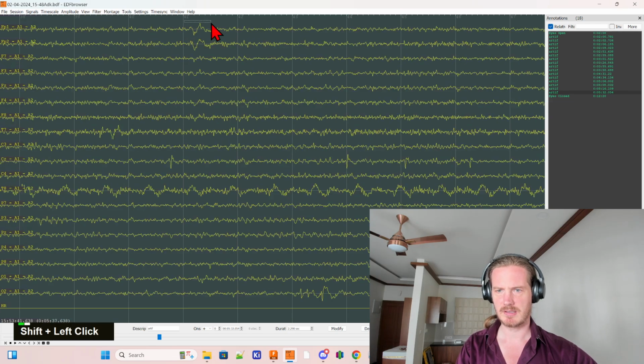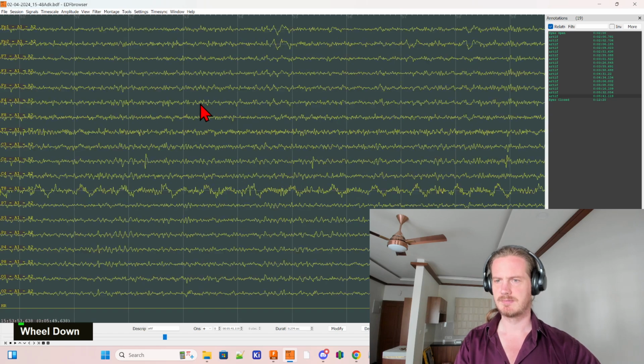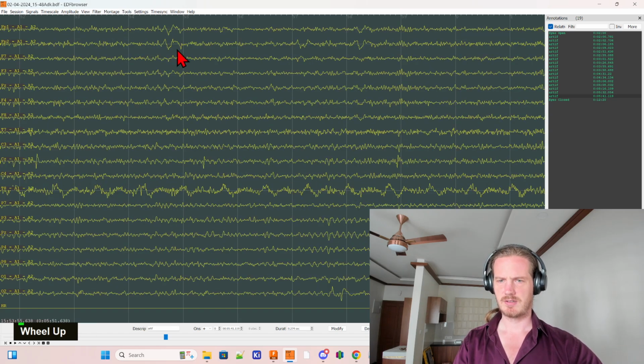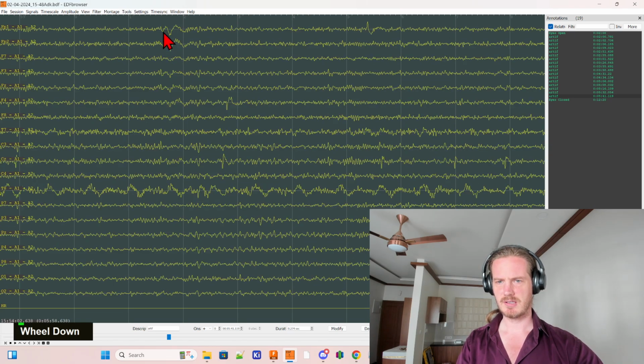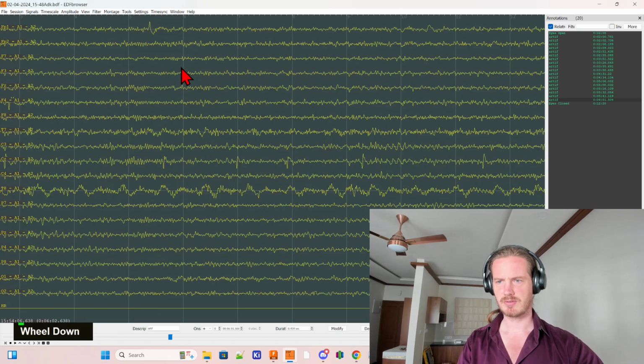Slight little eye blink here, let's just remove it. Something very slight. I'm going to leave this. This is really borderline on whether I want to remove it or not. This is also, I'm going to choose removing this one.